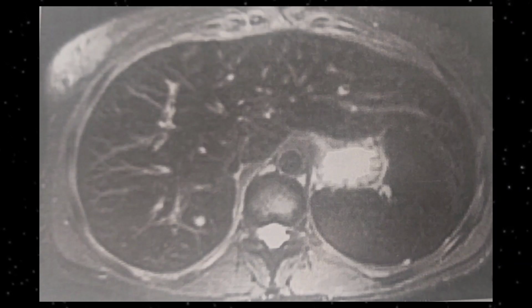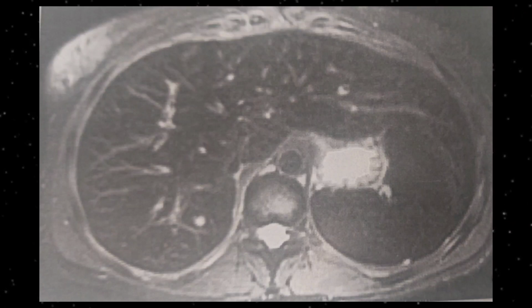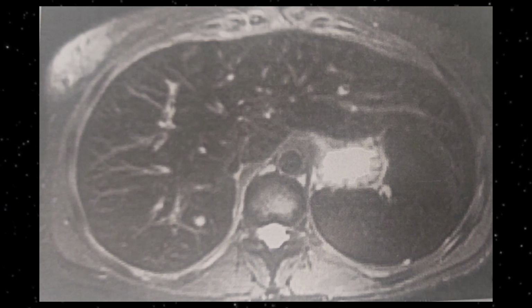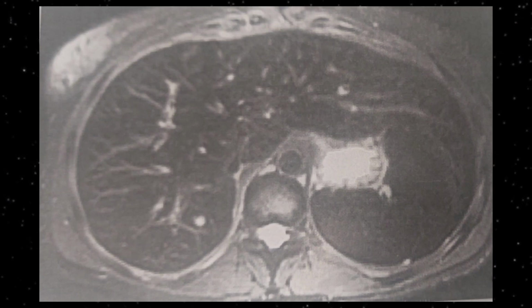This is another MRI scan. On this MRI scan you can appreciate abnormally low intensity, low signals within the liver and in the spleen as well. So bilaterally, the liver and the spleen are both affected. That is because iron is deposited in the reticuloendothelial system, so it affects the spleen and it affects the liver as well. So this is the case of hemosiderosis. So this is the main difference on the basis of MRI between hemochromatosis and hemosiderosis.